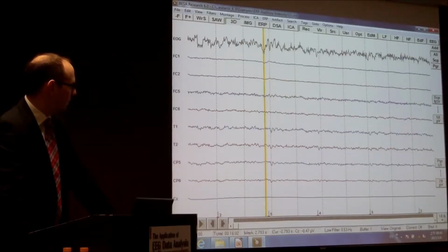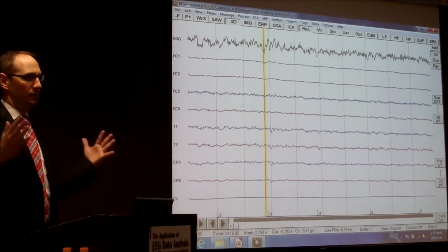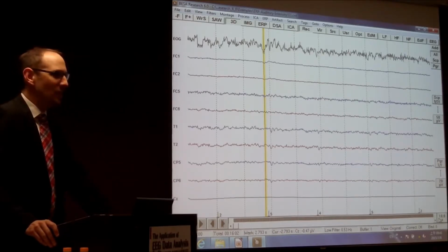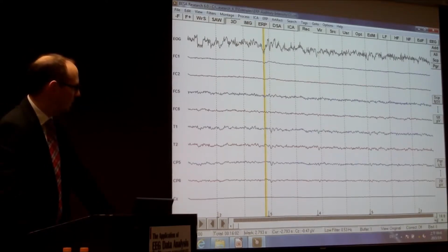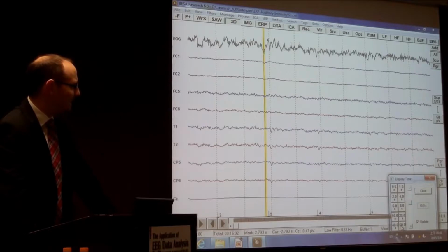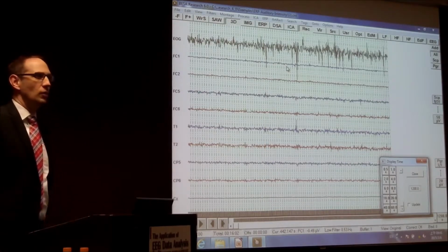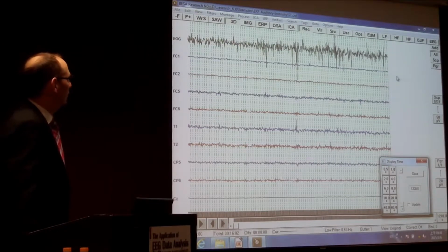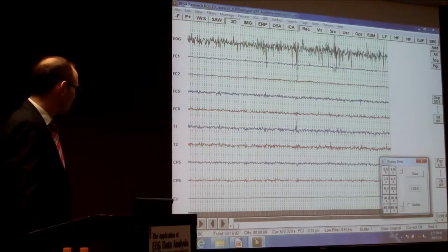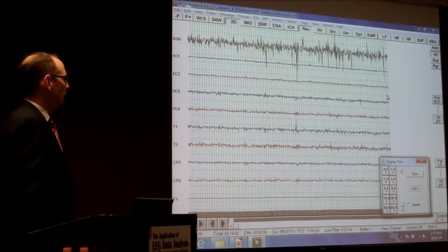Then we have a very interesting, very important thing here. Normally, everybody is looking at EEG data on a 10-second window, but depends on your research. If you're interested in ultra-slow activity, this is not a window you want to look at, so you certainly can adjust it. You just see 60 seconds here, but in fact it's going up to 20 minutes. And if I do this, yeah, you will see that's the whole recording now. The recording is altogether 16 minutes, so there's some space left here. And the whole window would then consist of 20 minutes.